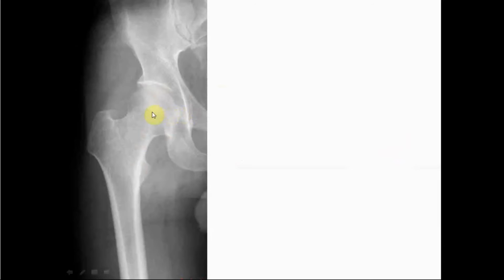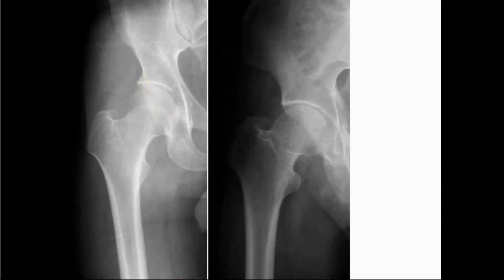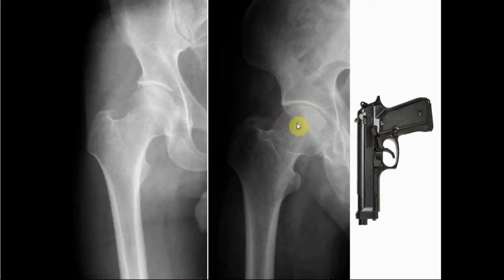This is the normal hip joint. We can see the head of the femur is spherical, and the head-neck offset is normal, it is concave. And the acetabulum is also normal, there is no over coverage from the acetabulum side. This is the CAM type of femoroacetabular impingement. As we can see, there is an osseous bump, the head-neck offset is convex, it is not concave, and this can lead to restricted hip joint movement and labral degeneration and tear involving the anterior labrum and anterior cartilage damage. This appearance of the CAM type of femoroacetabular impingement looks like a pistol grip deformity.